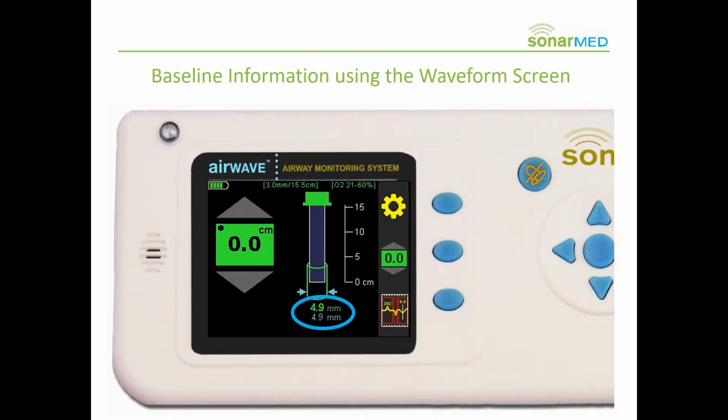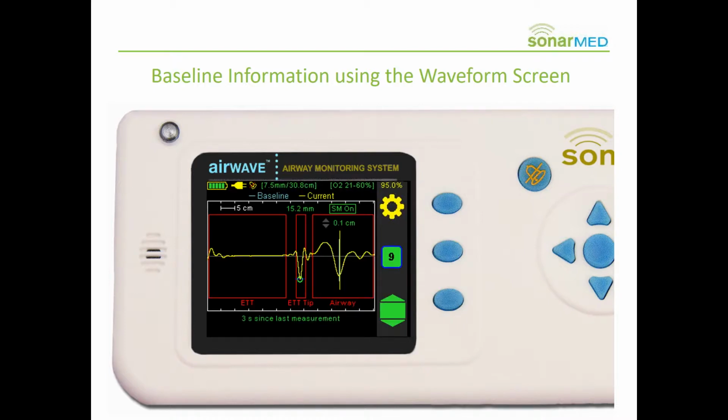This screen's really easy to understand, and the waveform is too, but it takes a little more time to understand it. So we're going to spend some time going a little more in depth into the waveform screen. Now remember, to get there, you press that bottom oval button by the icon that looks like the waveform. So here's the waveform screen, and in the video Tom talked with you a little bit about the top, but let's go over it again.